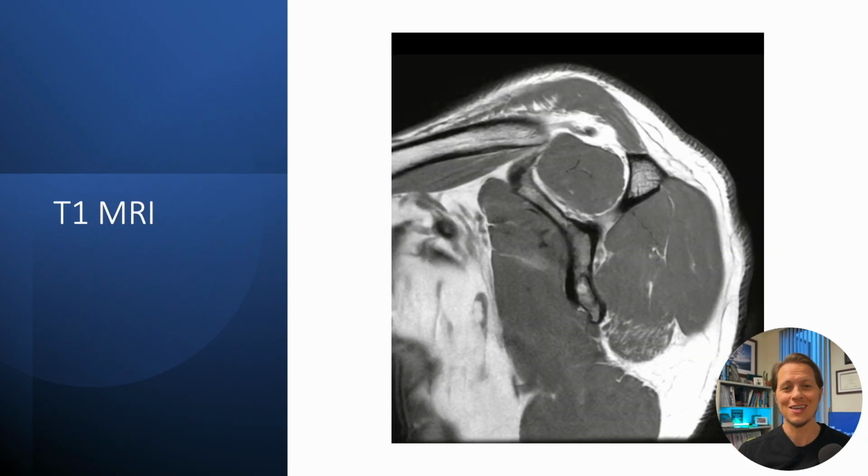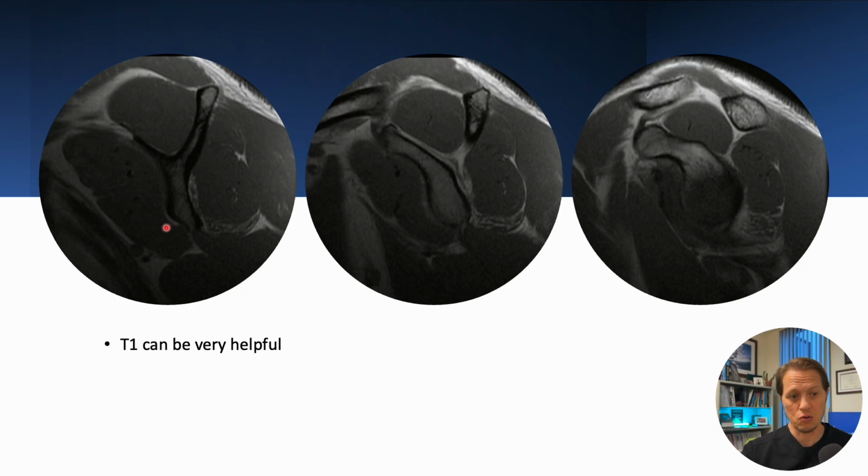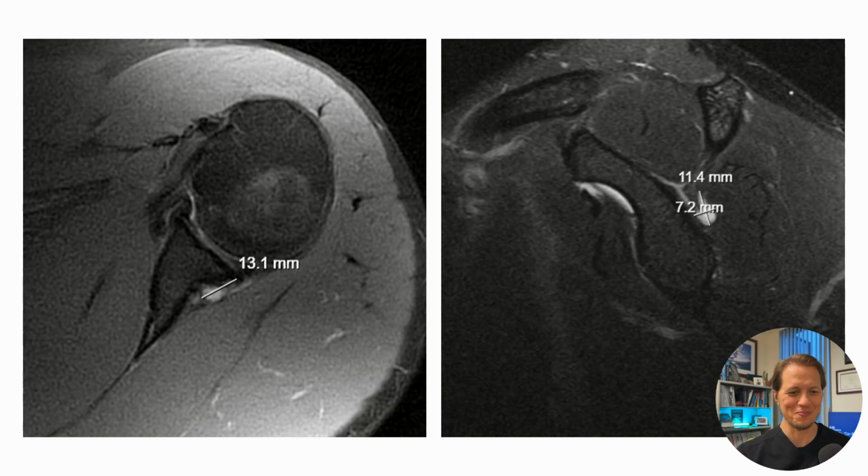Well, in this case, you've got to go to the T1. So here, supraspinatus here, very normal, subscap here, infraspinatus here. That's it right there. And when you line them up all together as you're scrolling through 1, 2, and 3, now you can really see that difference. That muscle is not healthy. That is atrophied. It's marbled. There's a lot of scar tissue, fatty infiltration. Not a healthy looking muscle like the supraspinatus. So T1 is your friend. Make sure you look at them.